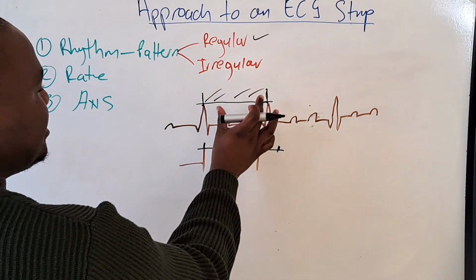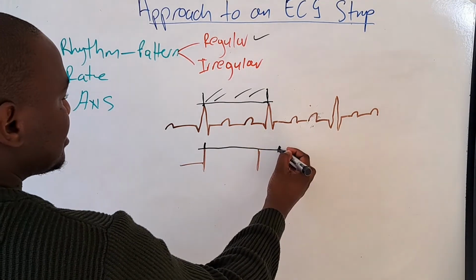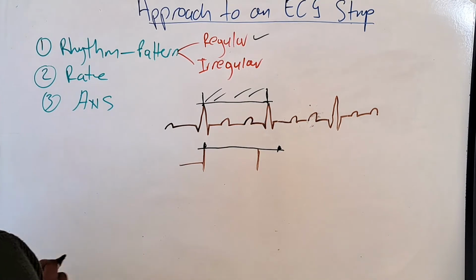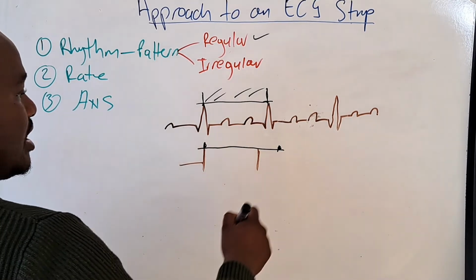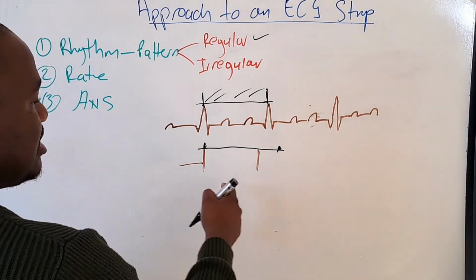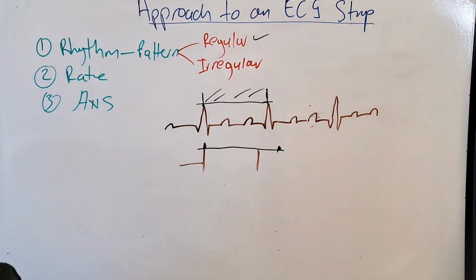So it's not fitting nicely. It's not well aligned. Your marks that you made with your pen are not well aligned with the RR waves. Then, if it changes all the time, it means that you have an irregular heart rate there. Why is this important?